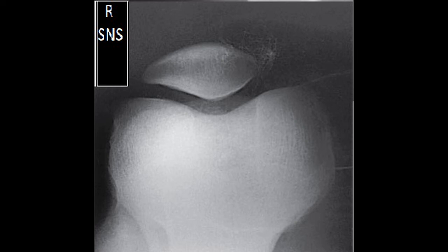All right, Danny, we've reached my final projection. Finally, the tangential projection of the patella and patellofemoral joint, also known as the Settegast method, and one of the more frequent exposures taken at the site that I'm at. So we're almost done. There is evidence of proper collimation, and my marker is on the image. You can see the patella in profile, the femoral condyles and intercondylar sulcus are also visible, and you can see the open patellofemoral articulation and the soft tissue and bony trabecular detail of the anatomy.